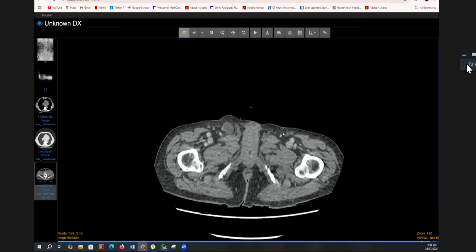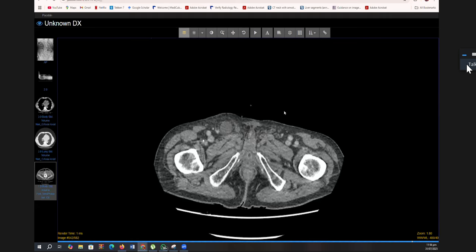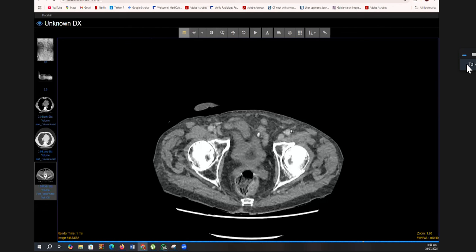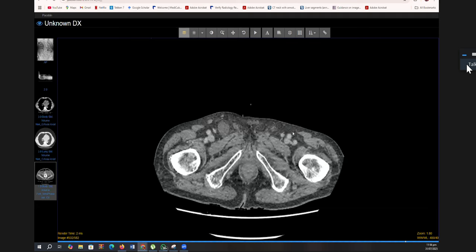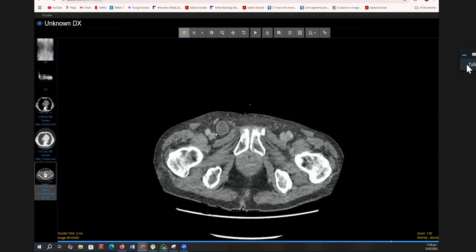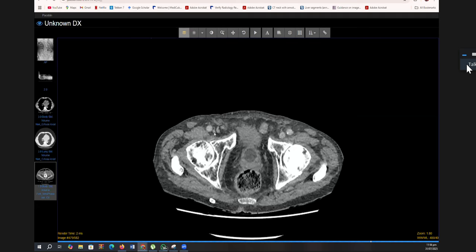There's an even more specific sign than just being parallel to the vessels. What do you think the hernia and the bowel within the hernial sac does to the femoral vein? It is compressing the femoral vein. Yeah, can you see that? It's a very nice example. It is then the compressed femoral hernia that's causing the small bowel dilatation. And you can see the transition point. There is the transition point.